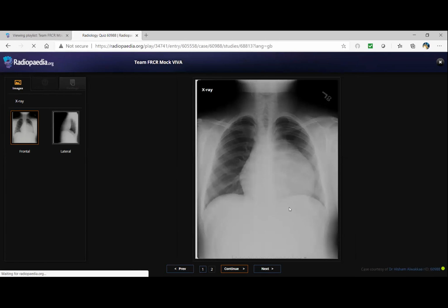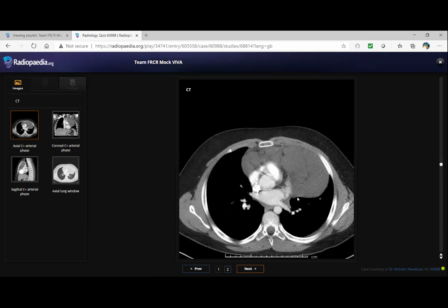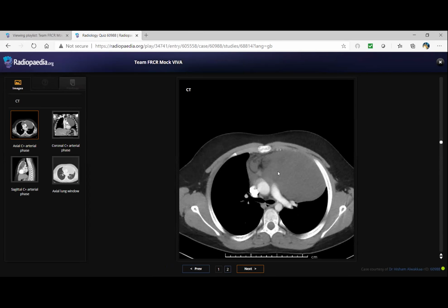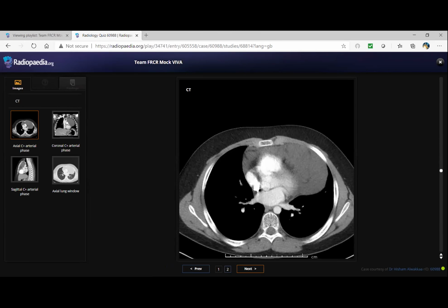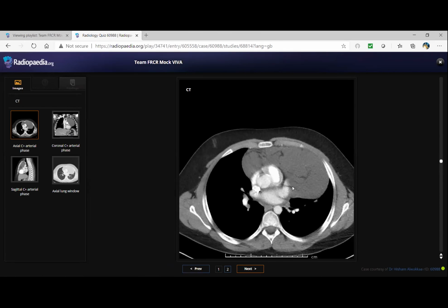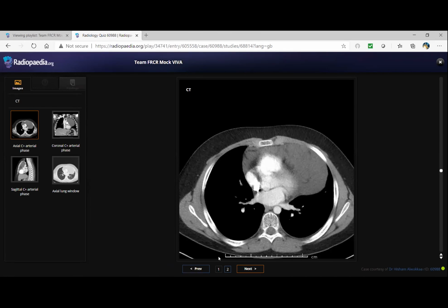And this was a very good description because you could see the vascular markings, as you mentioned. It is very deceiving that it could be a part of cardiomegaly. However, when you check that the vessels are seen through the mass, then you know that this is just something superimposed on the cardiac shadow. And then the non-enhancement pattern and the linear hypodensities over here, and the lack of any calcification or fat content, this turned out to be a case of a venolymphatic malformation, okay?